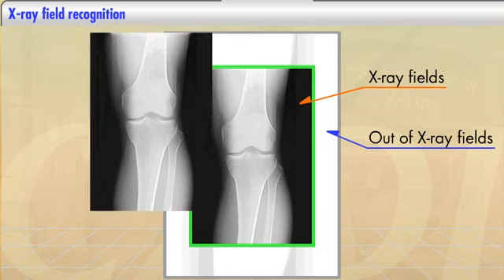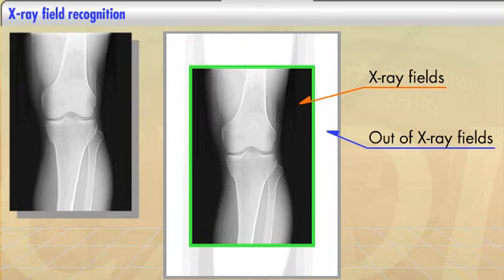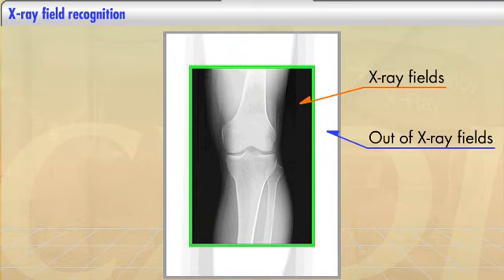The image data for the exposure area decided here are ultimately isolated and output onto film, transferred in the form of an image data file, and stored.